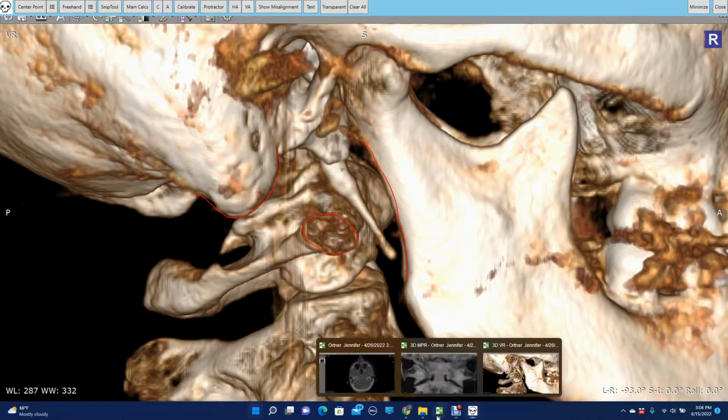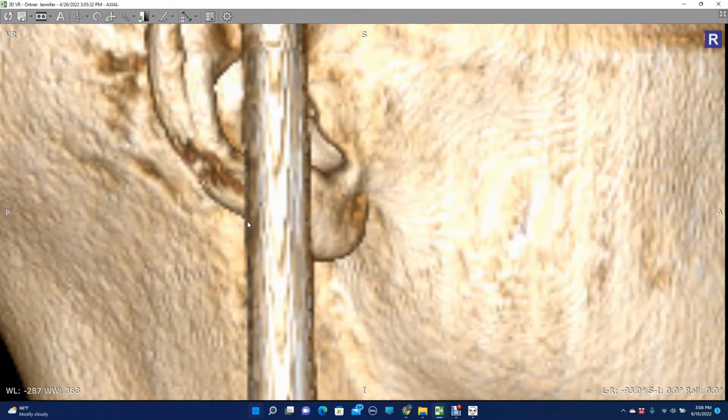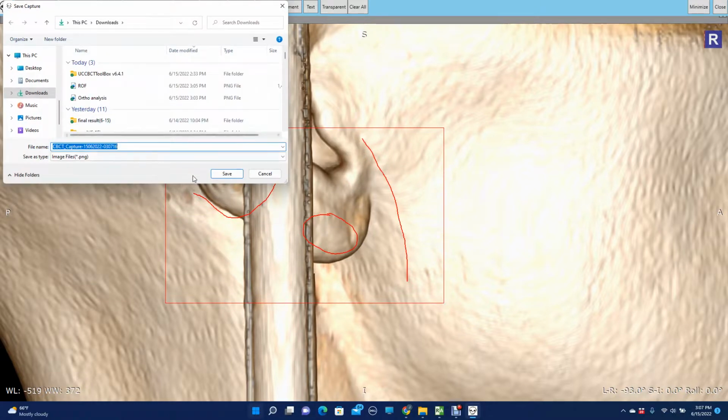If we jump back into our Radiant viewer and click density, we do this until the earlobe and skin superimposes. This bar is an artifact from the cone beam scan that we could have trimmed out if we wanted to. But when we open up the toolkit again, now we can see exactly where that transverse process is. It's right under your earlobe, like a little earring. And we have an external viewpoint reference of where to be aiming our adjustment. And we know exactly where that mastoid is in reference to it. I will use the snipping tool to grab all of this and save it for later.